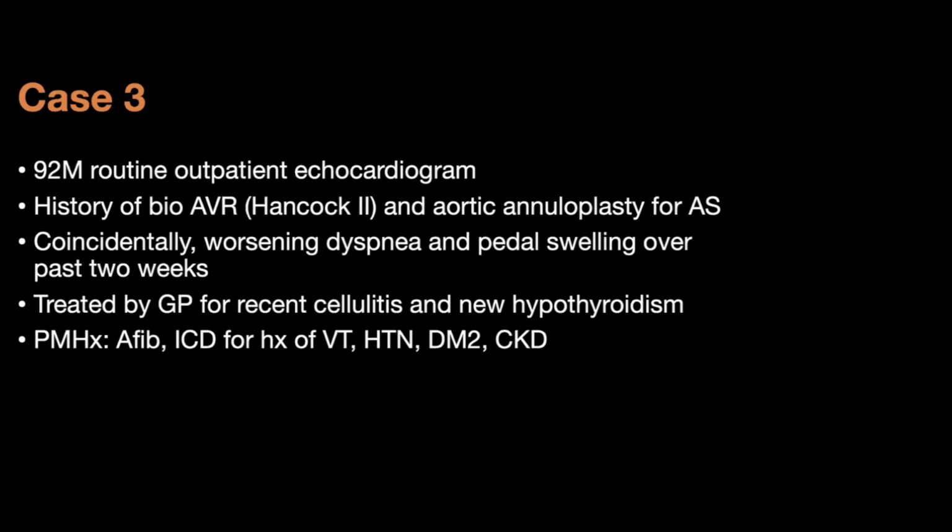But in terms of this case here, this gentleman was treated for cellulitis by his GP recently, and kind of complained as he was getting his echo done. He had a lot of swelling, peripheral edema, with his caregiver that was with him, and he has a known ICD, AFib, and some underlying risk factors like CKD.